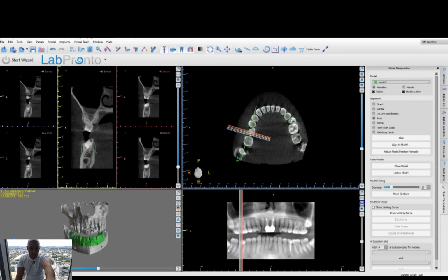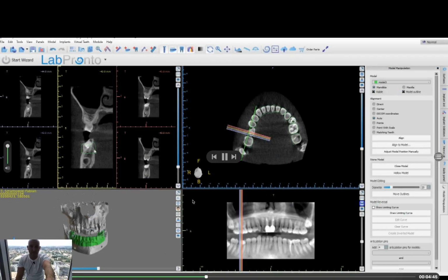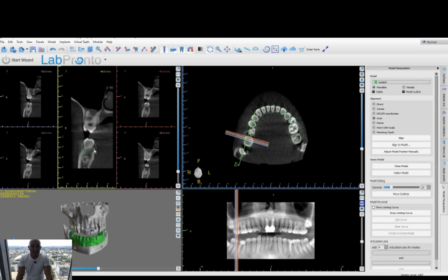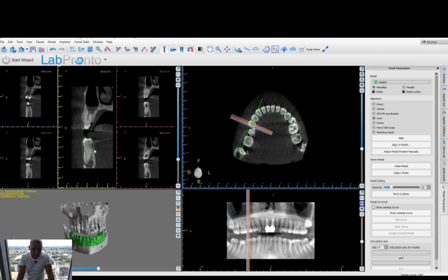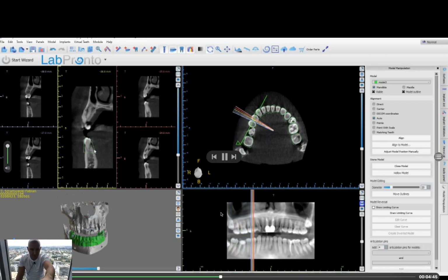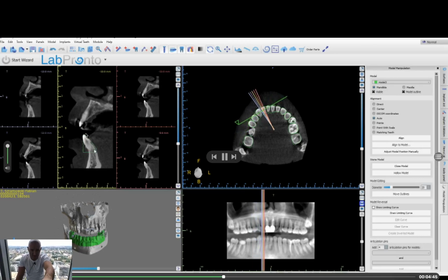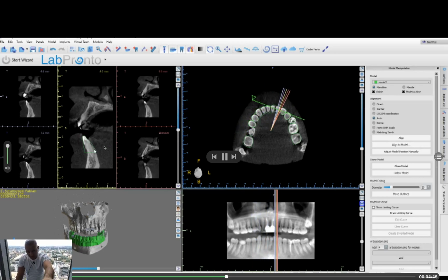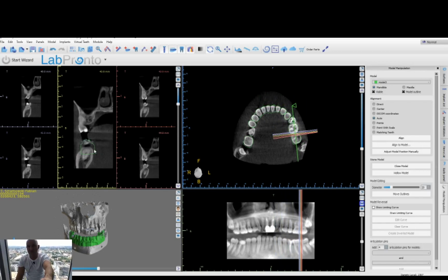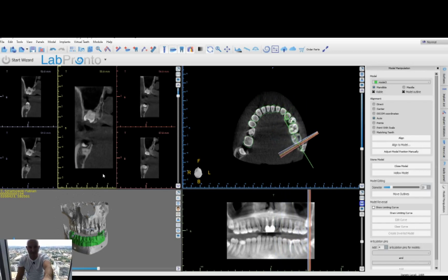So this is the first model. Then we need to do the same thing with the other model, but first we check if the matching is accurate, and here you can see that it is, because all the points are correctly placed.